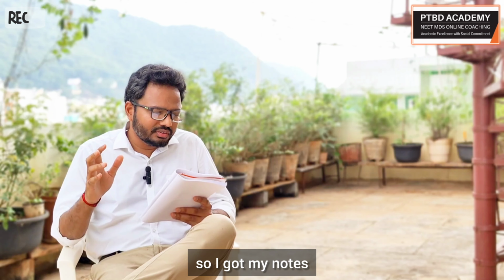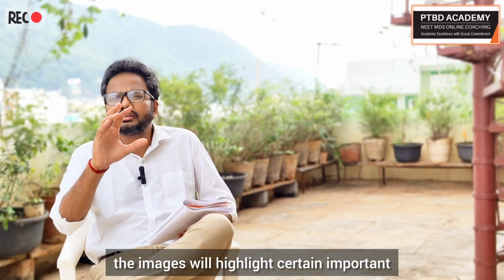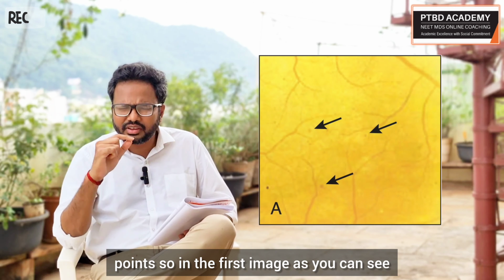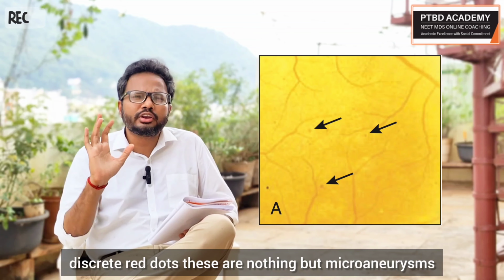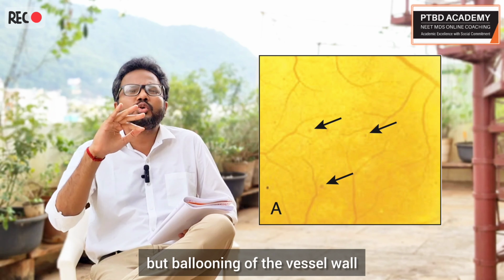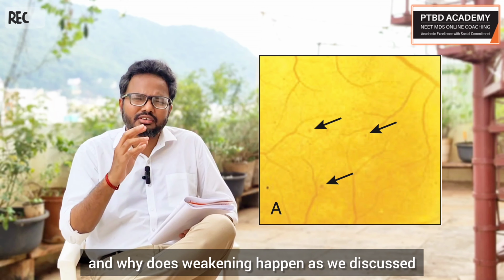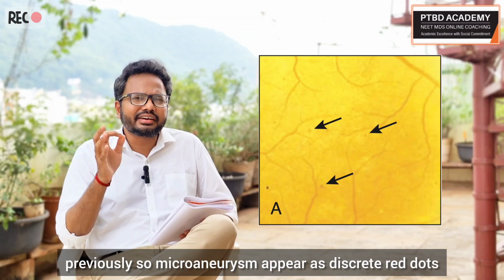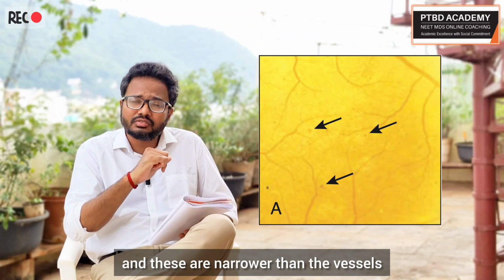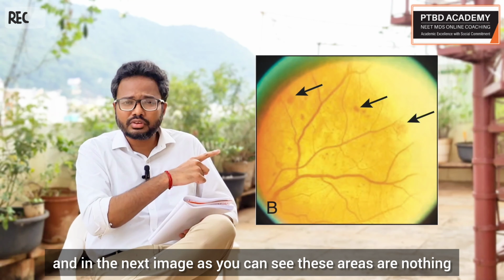So I got my notes, and as I project the images, we'll highlight certain important points. In the first image, as you can see, discrete red dots, these are nothing but microaneurysms. Aneurysm is nothing but ballooning of the vessel wall because of its weakening. And why does weakening happen? As we discussed previously. Microaneurysms appear as discrete red dots and these are narrower than the vessels if you carefully observe, isn't it?